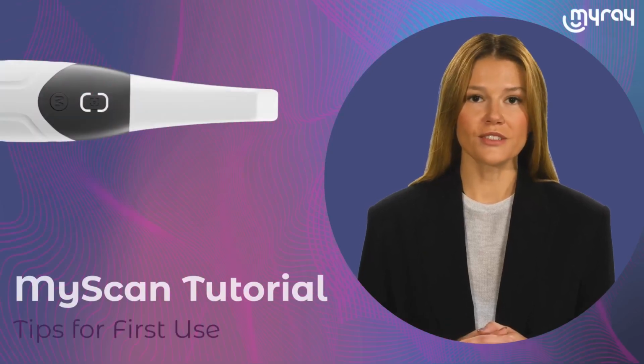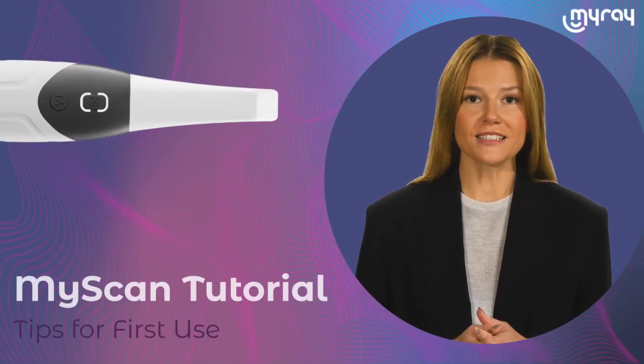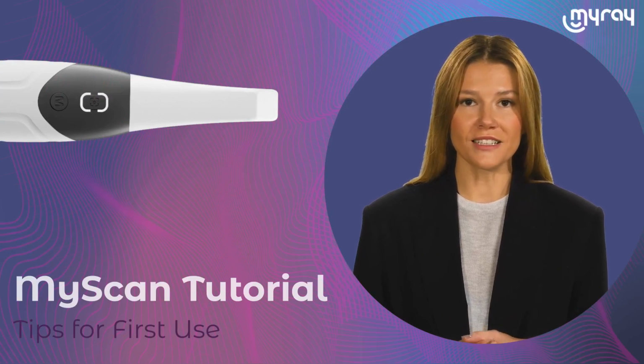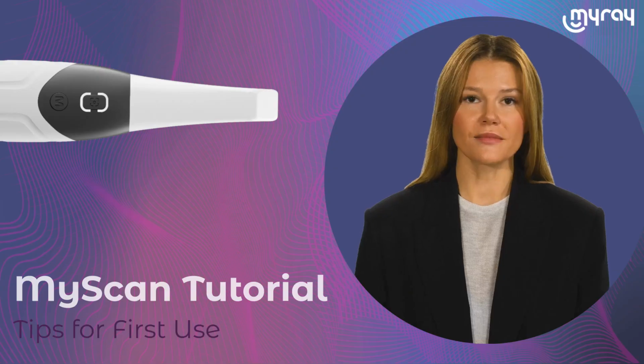Welcome to the MyRay tutorial section. Let's see some suggestions to start using the intraoral scanner in the MyScan Connect software to the fullest.